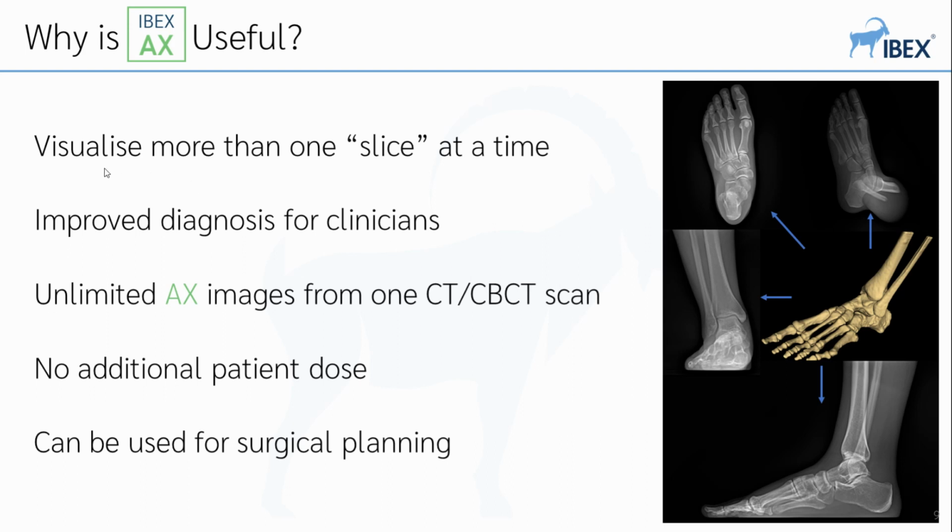Next, many clinicians are very used to using 2D radiographs rather than 3D data, so using AX can help to bridge this gap between these two data modalities, and so the use of these 2D AX images can help support diagnoses made using the 3D data.